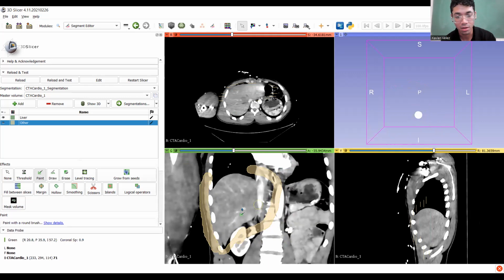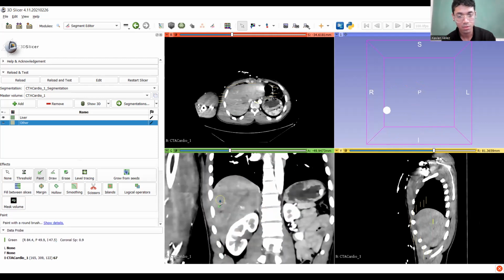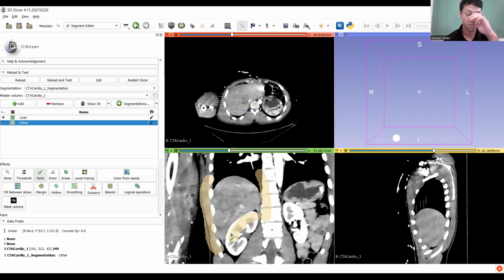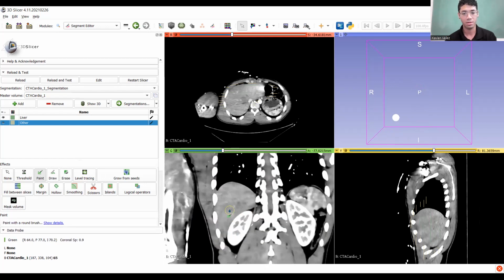Okay. And I'm just gonna continue. We're really starting to get towards the end now. Sweet. Get that kidney out of here. Spine is not kidney. Who'd have thought? All right. That bit, that bit, that bit.